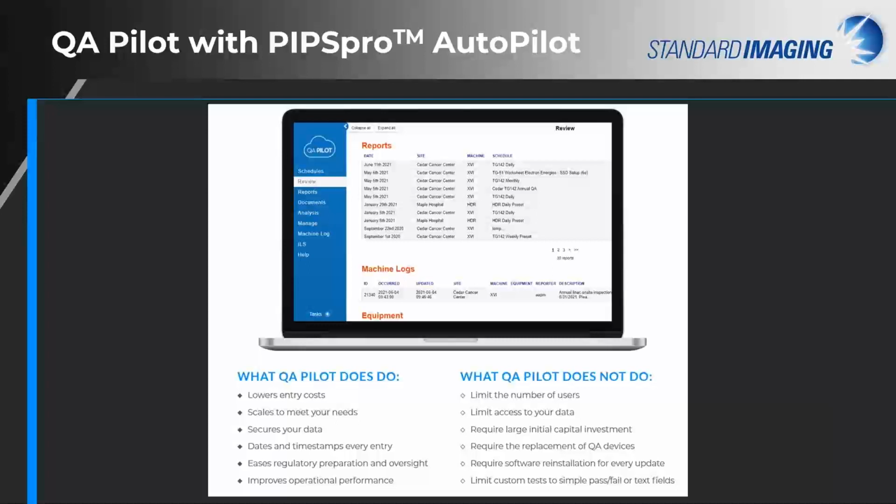Process improvement goals and results can be tracked within the system, and performance against service contracts is again something that you could follow using the machine logs available in the system.